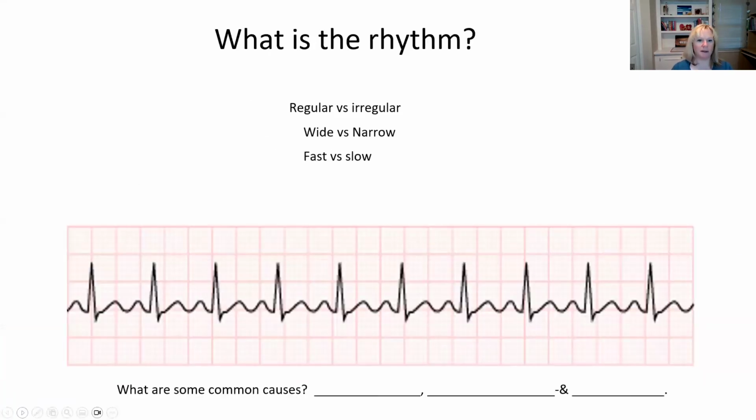Okay, let's keep going. Now, this rhythm is one that is still sinus, but it's fast. So it could be flutter. It looks fluttery to me. But at the end of the day, we would need to do a 12 lead. And this actually turned out just to be sinus tach, but they can look identical. So doing the EKG, the 12 lead, is going to be the key.